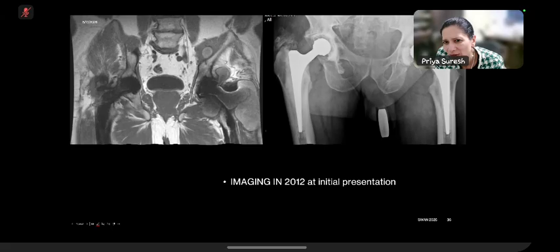This around the greater trochanter is heterotopic ossification, new bone formation that the patient has. Look at all these changes here, that's not right at all. That looks like pseudotumor. Look here as well. It is as if there are soft tissue masses that you can see in this patient. That's what you're looking for when you're looking for a pseudotumor presentation. In this case, this here is a change in the T1. That's normal marrow. These are changes in the T1 on that side.